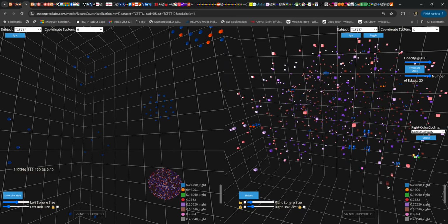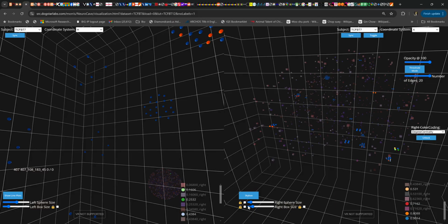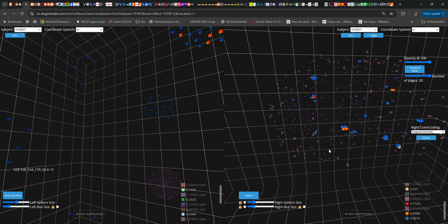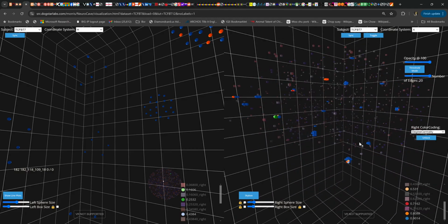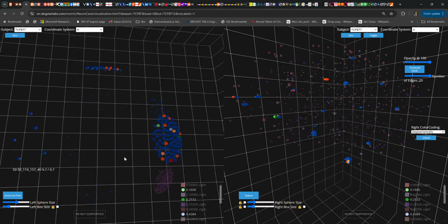So in this color scheme, the squares represent the healthy tissue nodes that are not masked from the tumor, and we can click on them and gray them out and also reduce their size, maybe increase the size of the spheres, so you can really see the tumor regions in the context of which brain anatomy regions they're situated at. And you can also see how the different values of degree centrality spread across the different clusters.